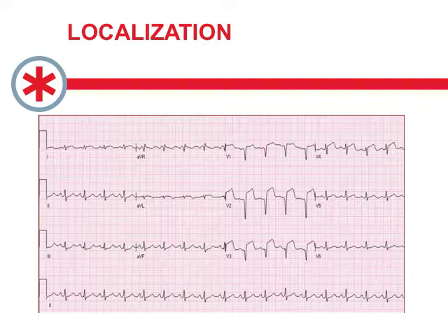So for those who have had a peek at it, I think you're going to see the ST elevation, certainly V2, V3, V4, a little bit in V5, and I think you can convince yourself there might be a hint in 1. And then you've got reciprocal ST depression, particularly evident in 3 and AVF, although a bit in 2. So really, we're looking at an anteroseptal MI.